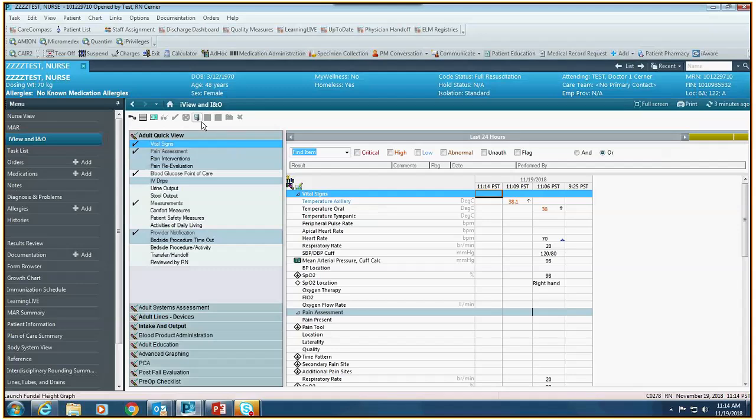So in order to associate a device, you would come up here. You see this little associate device. Remember, if you don't know what anything means or what this little icon is, just hover to discover. It'll tell you exactly what it is. So associate device looks like a little cell phone. I'm going to click on that. Give it a second. It takes a little bit for it to load.